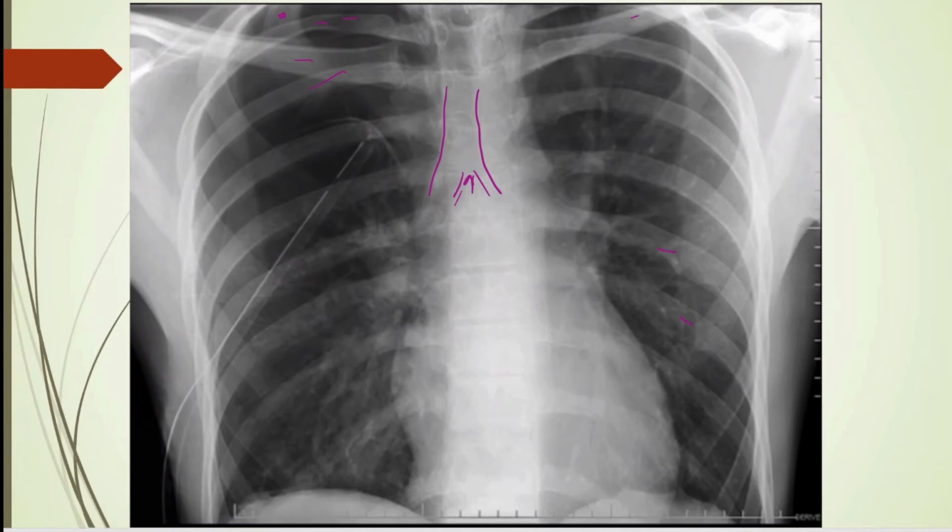Okay. But you do see a couple funny things. We'll pick that up here in a second. C for cardiac silhouette right here. D for diaphragms, what diaphragms you do see. Oops, can't draw. All right, E for everything else. So let's do patient's left side first, because we know something's going on with the right side. And I see good lung markings all the way out. So left lung looks fine.